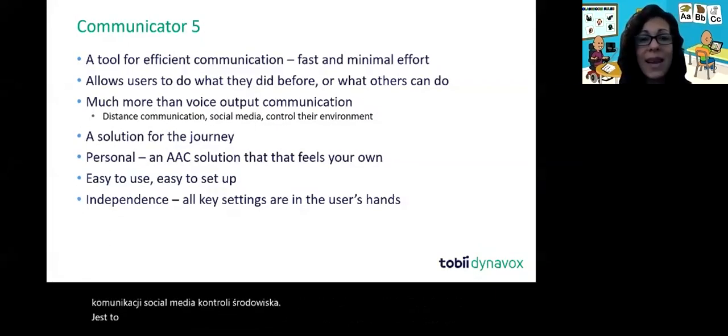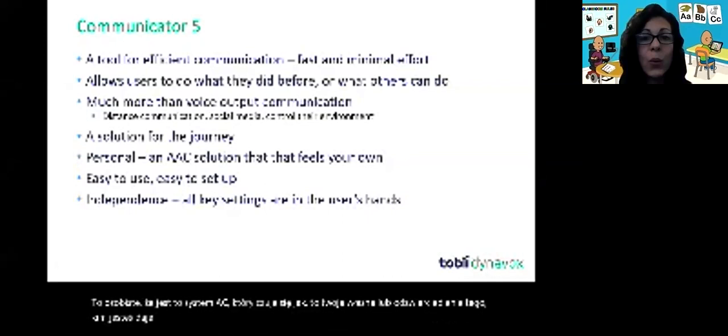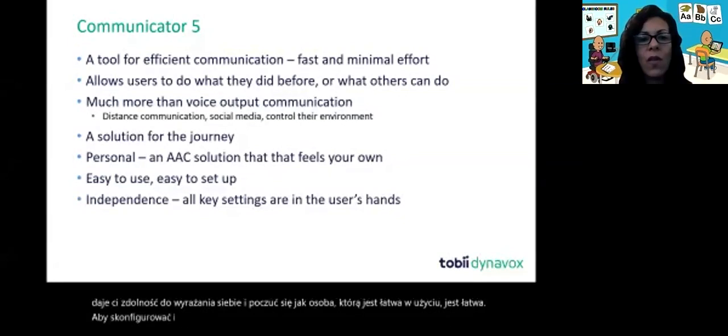It's personal. It's an AAC system that feels like it's your own, or a reflection of who you are, and gives you back the ability to express yourself and feel like an individual. It's easy to use, it's easy to set up, and all the key settings are in the user's hands so that they are independent.